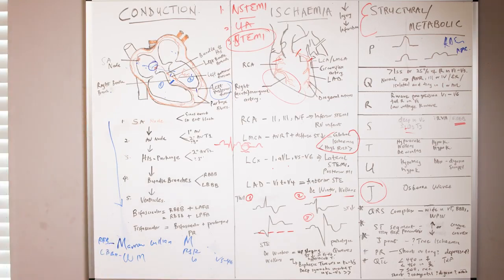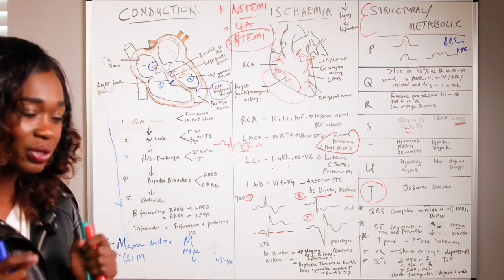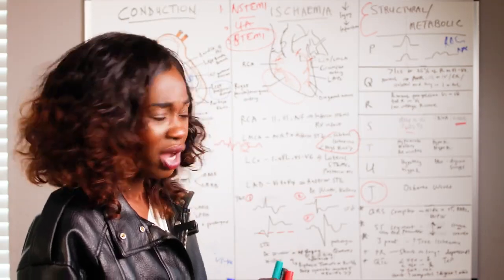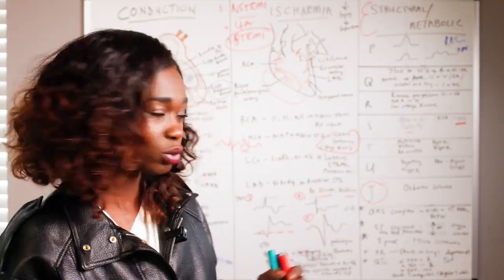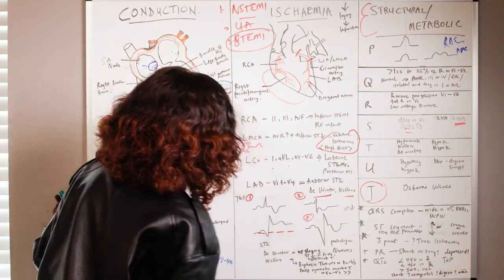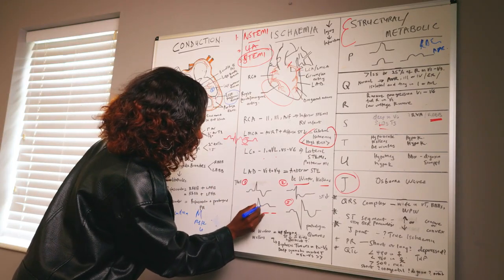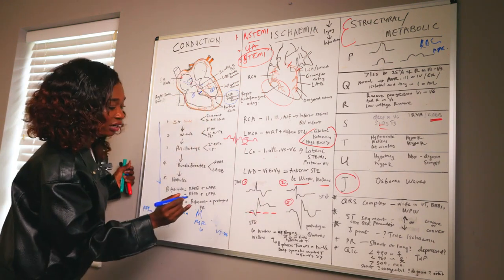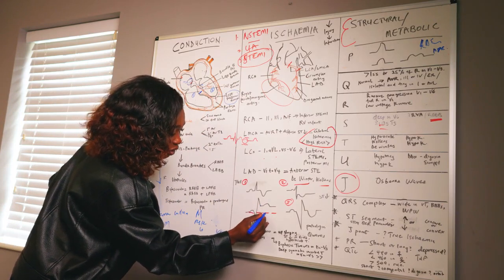When we are talking about the J point, this helps you. I remember when I first started learning ECGs, and I took an ECG straight to my superior at the time, and I said, "Oh, there is some ST elevation going on here," and he just laughed and he said, "No, calm down. Draw a line, and this is the line I've drawn here for you." And he says, the point by which your QRS goes to try to join the isoelectric line. Ideally, your QRS should come all the way down here, right? To join this isoelectric line.